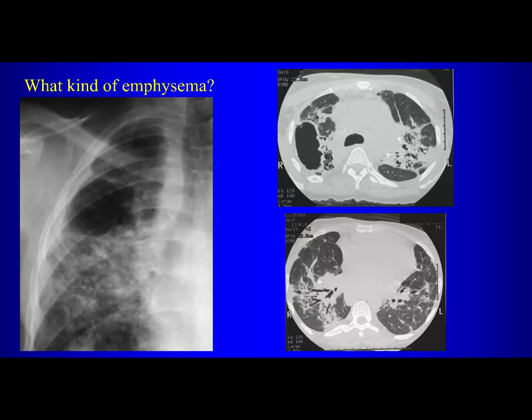All right? And then when we have large areas of fibrosis that might simulate masses, they can occur from TB or sarcoid, and we call that what? The galaxy sign. Well, the galaxy sign is a sign of it, but what is the process? Progressive massive fibrosis. Okay, so this is a patient with fibrosis. So that large air-containing lesion represents, is that panlobular emphysema, central lobular emphysema, what is it? It's emphysema from scarring.